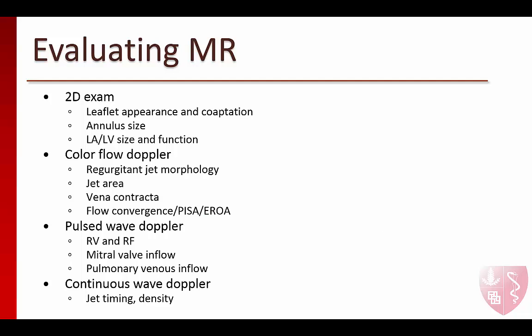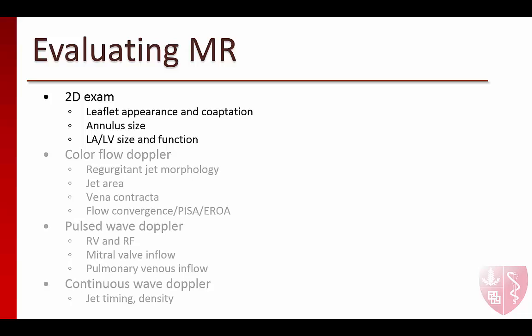This is the outline we will use to describe the echo evaluation of MR. First, let's look at how we use the 2D exam to evaluate MR.